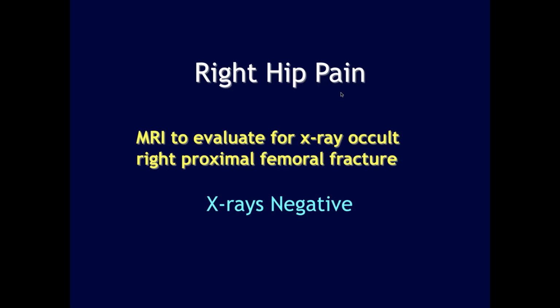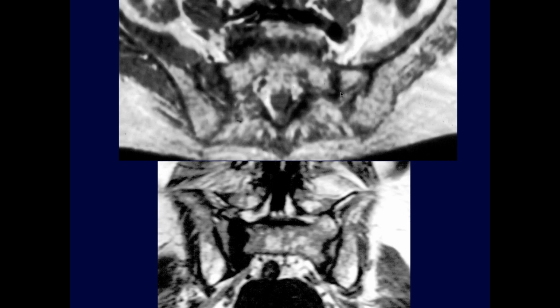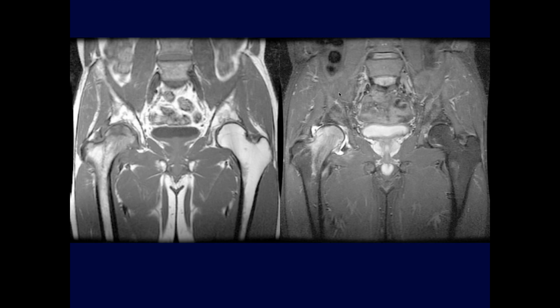So this is a patient who just presented with right hip pain, only right hip pain, and the problem actually were bilateral sacral fractures. Yeah, bilateral sacral fractures, and a lot of times you get that transverse fracture going through, and that's where you get that Honda sign. But I don't really see that on this one. Right. Exactly. Right.